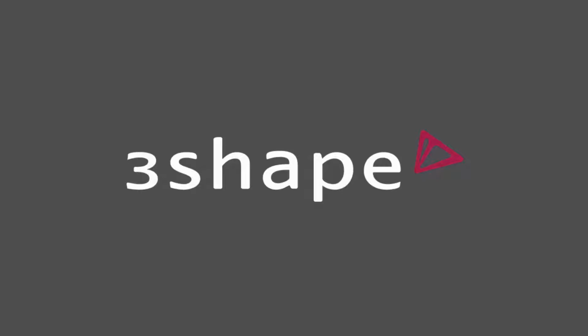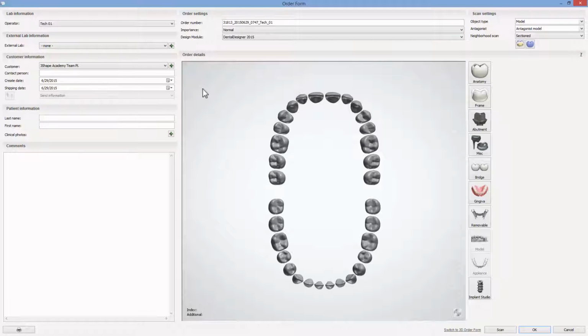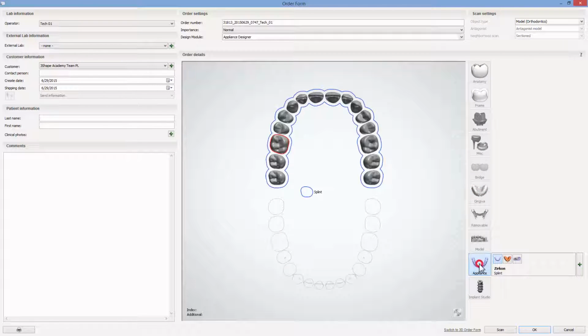In this video we are going to show you how to design a splint with bar using 3Shape Dental System. This possibility has been now added to a wide range of available indications. For Splint Design, Dental System will automatically move to Appliance Designer. To start your design, fill in the order form.